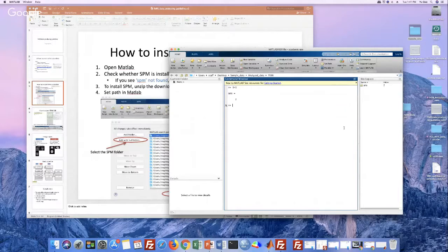On the right side of the command window, we have the workspace. Here you will have all the variables you defined, or any variable you have got. Because we asked the computer to compute 1 plus 1, it automatically gives us a variable called ans, which is the answer.